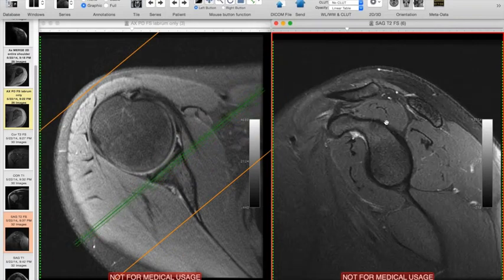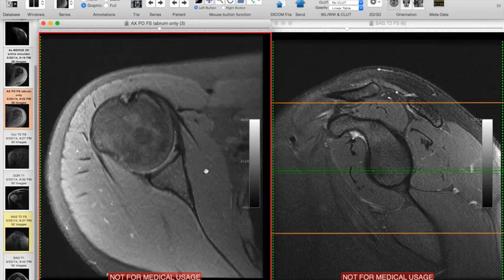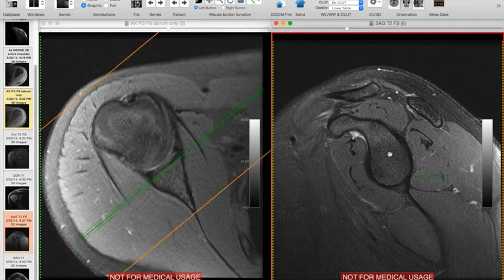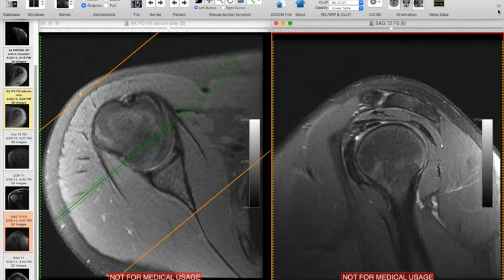So normally you'd have like a 12 o'clock position, and then anterior is going to be 3 o'clock, 6 o'clock, 9 o'clock. And if you look at the reference of the axial images to the glenoid, sometimes it's confusing, or sometimes you think you're more inferior than you are on the axial images, but the reality is in this patient, the most inferior image that we're seeing labrum here is in fact fairly antero-inferior along the glenoid, and that's where tears often occur. So that's an important point to keep in mind.